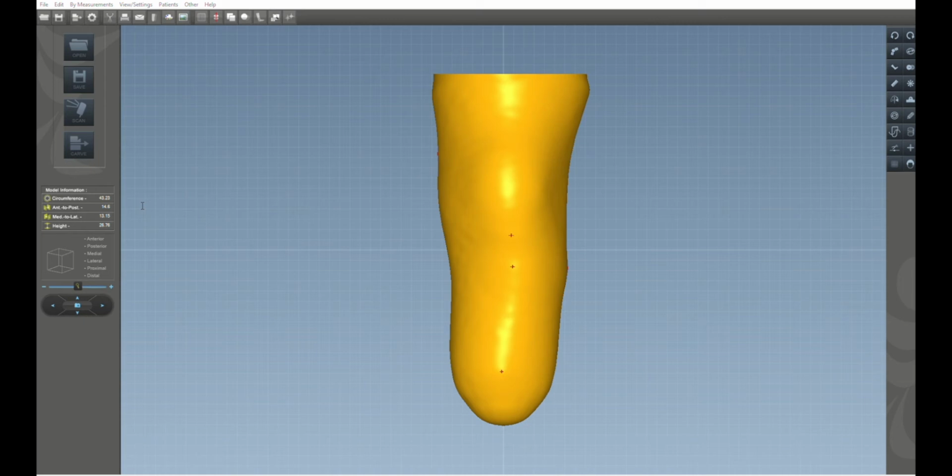If you don't use the Medico format, if you use AOP, or if you have access to other formats, then the notes won't be saved with the model. Okay, so I give it a name. I say save, and so now my model is saved.